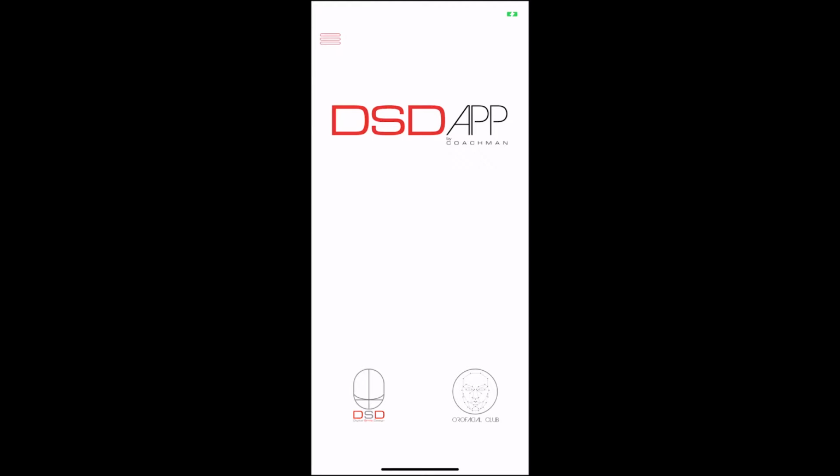After you design your smile, you will also be able to create measurements that will enhance the way you communicate with your dental technicians and other specialists involved in your treatment plan.